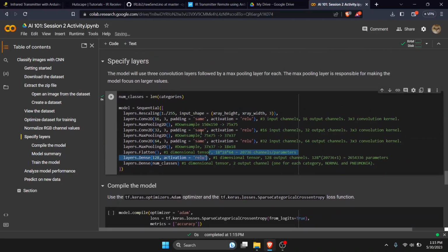Now again, it's more technical how we're going to use these layer functions because it needs a lot of explaining to do. So right now we're just going to skip over this detail. But essentially, since we're using a CNN architecture, we're going to use convolution layers.